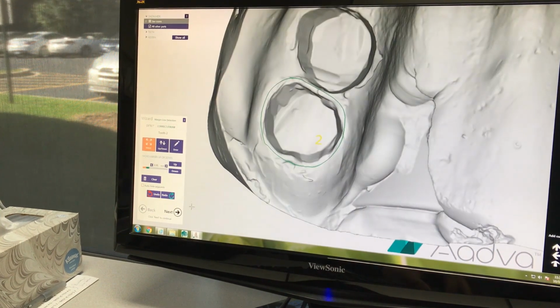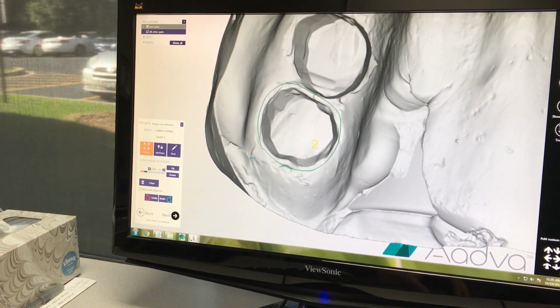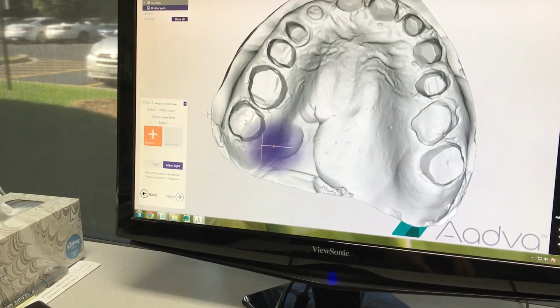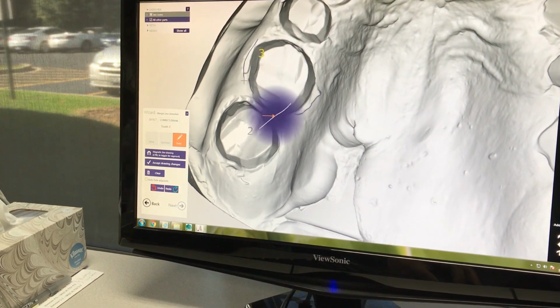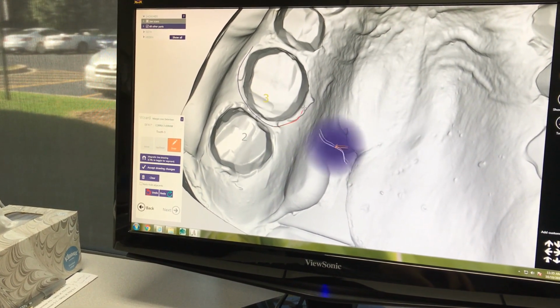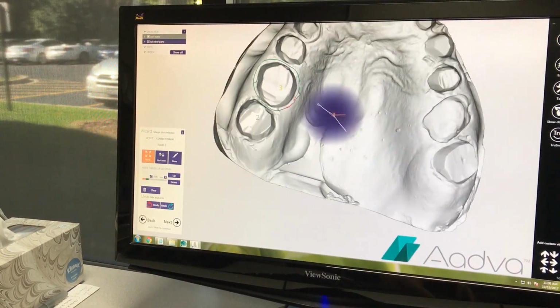We got a couple of red arrows indicating that it's not the best. So we're taking the outer contour mostly. The margins aren't super precise, but that's what we need. We don't need them to be super precise because afterwards they're going to be worked on, they're going to be milled out in wax, and so we don't have too much of a problem with that.